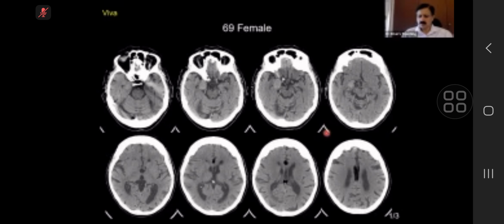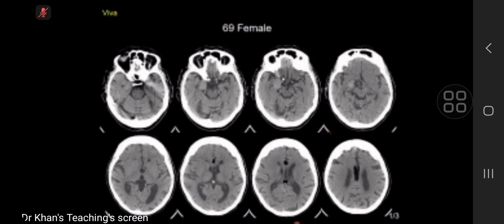Over to you. Okay, so these are selected unenhanced CT images of the brain for a 69-year-old female. There are two striking abnormalities, one being a midline low-density lesion, which could be of fat or air, presumed to be an interhemispheric lipoma. Another abnormality is seen in the region of the right temporal lobe around the internal carotid artery, where it segments into the middle cerebral artery.